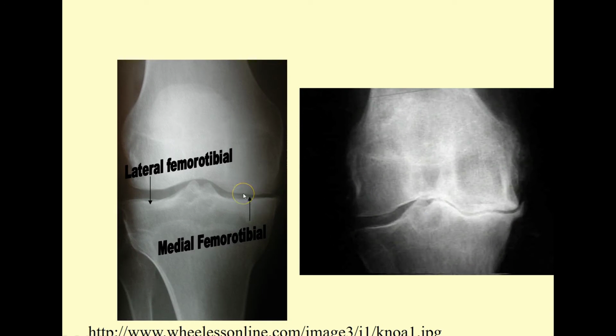A little earlier example, again, medial compartment, the very beginnings of an osteophyte formation. We still can see the tibial eminence is starting to get blunted just a little bit here, but not very seriously. And because of the change in load here, we can start seeing what appears to be a little widening. It's not uncommon for actually the lateral collateral ligament to be very sore, or the lateral part of the patellar retinaculum, even though it's this side that's the more abnormal part.